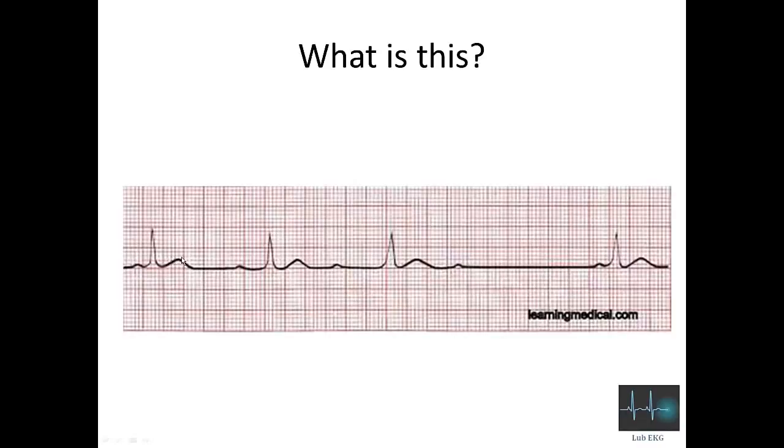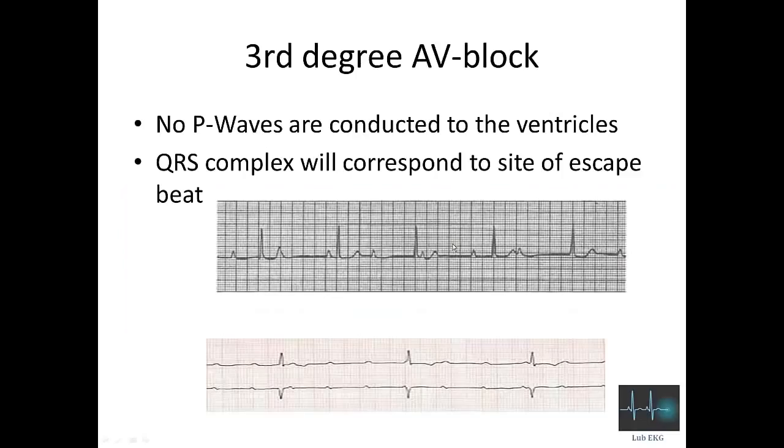So which one is this? P, Q, R, S, T. P, Q, R, S, T. P, Q, R, S, T, and then nothing. And you can even fit a picture of Dr. Wenckebach. So this would then be type 1, because you can only fit one picture. Get it? Very good.